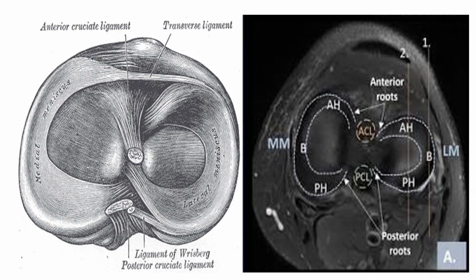Now the lateral meniscus attachments. It attaches to the tibia, joint capsule and the popliteus via the popliteomeniscal fascicles. It does not attach to the lateral collateral ligament, and this explains why it moves more during knee motion. So the anterior horn or root attaches to the tibial plateau immediately lateral to the tibial attachment of the ACL on the intercondylar area. So this is the anterior root attachment just lateral to the ACL attachment on the tibial plateau.